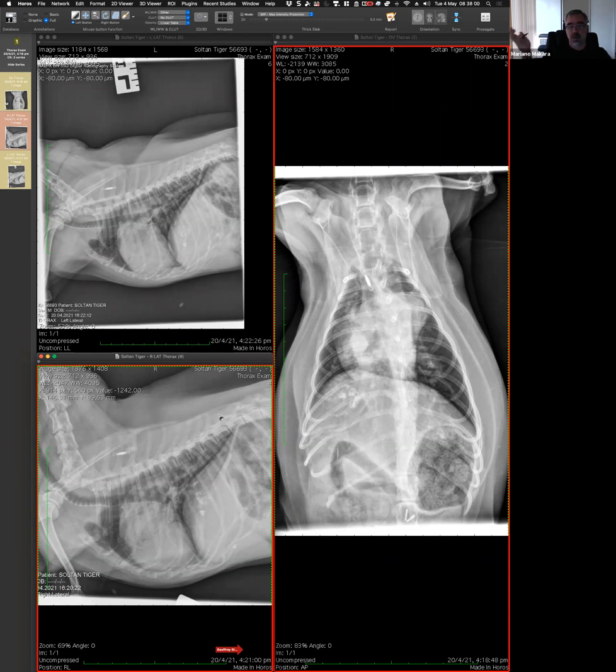So think aloud about the possible causes of that. So one is heartworm, so that's a disease within the arteries. And here the list is a bit annoying, and I probably go to the book to open my mind. Well, a leaky or defective right atrioventricular valve, perhaps. Which one?